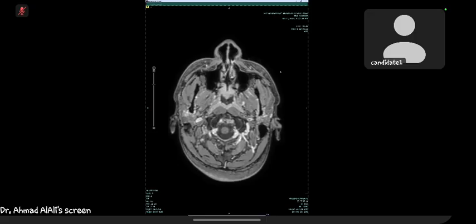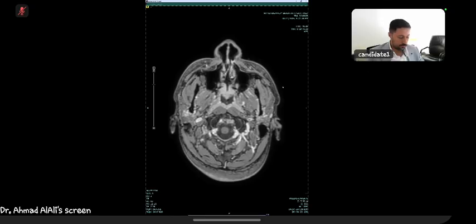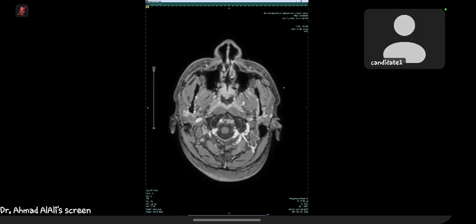This is left transverse sinus as well as the left side internal jugular vein, there is some filling defect in the left internal jugular vein. So summing up all these findings, the dural venous sinus thrombosis due to some infective pathology, cerebritis is going on. Cerebritis in the left frontoparietal lobe with dural venous sinus thrombosis.